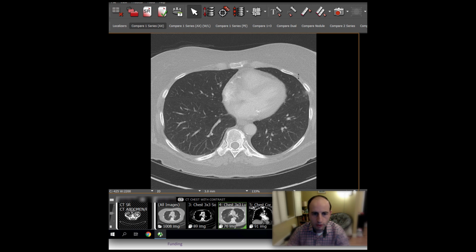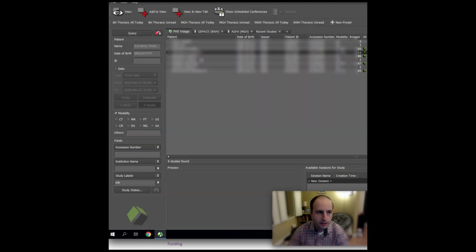This patient had a relatively benign course to their disease. So they were not re-imaged, but you can see that early on it can be asymmetric, but the reverse halo sign was described in a number of these series. It is a feature that we tend to think about more with organized pneumonia, but in many cases, organized pneumonia is actually a reaction to some process, for example, viral pneumonia, like in these patients.